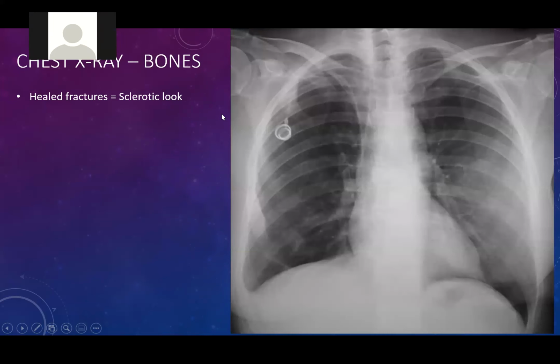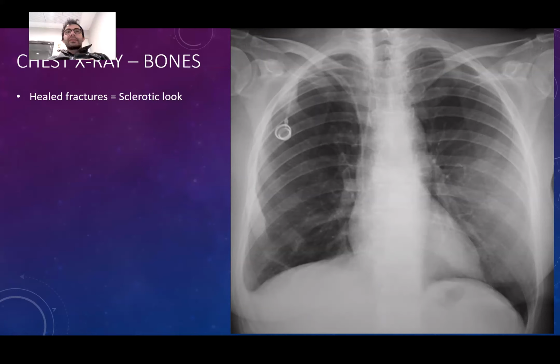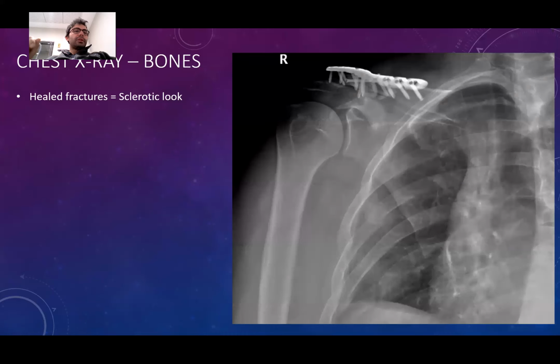Hocam, do we need to... Yes? We need to know if it is from the posterior or the anterior ribs? I'm sorry? We need to know the fracture in the posterior or the anterior ribs. Of course. Do you see it in the posterior or on the anterior side? It's in the posterior. This is in the posterior, right? We know which are the posterior images and which are the anterior images from counting the ribs, okay, for inspiration.